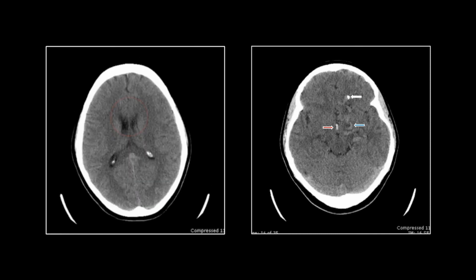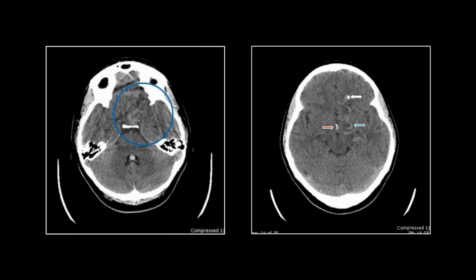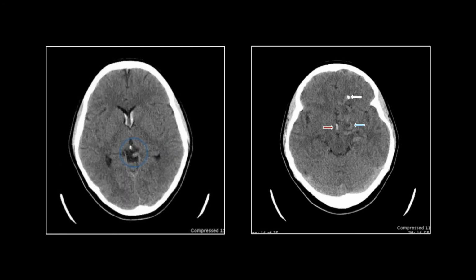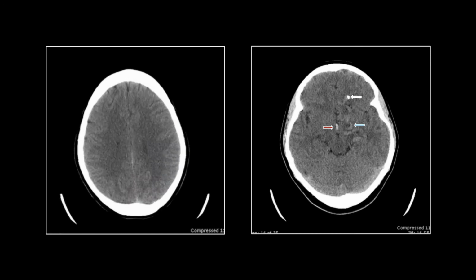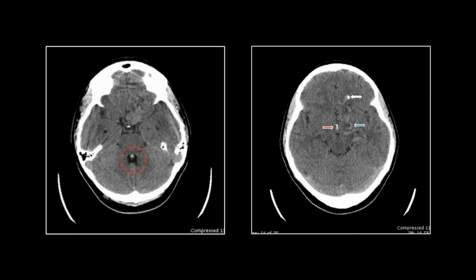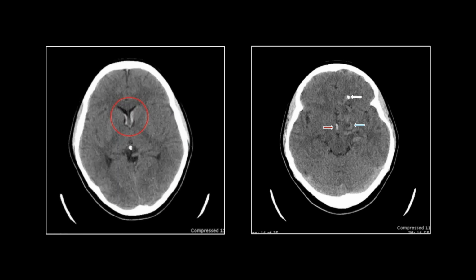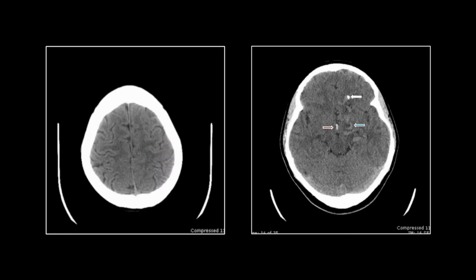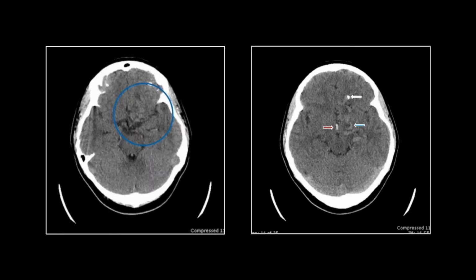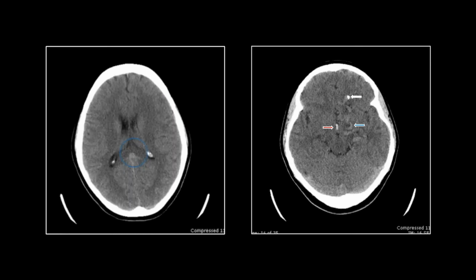I've had a few of the newer radiologists sometimes ask, why is the clot smaller than the ventricles? You can see this is a great example of that, right? The clot is smaller than the fourth ventricle, than the third ventricle, and the lateral ventricles. And the reason, of course, is that you bleed intraventricularly, that clots, matures, and then you get hydrocephalus on top of it. So the expanding ventricles give you essentially a cast of the earlier size of the ventricle. So that is a big AVM with acute intraventricular hemorrhage.